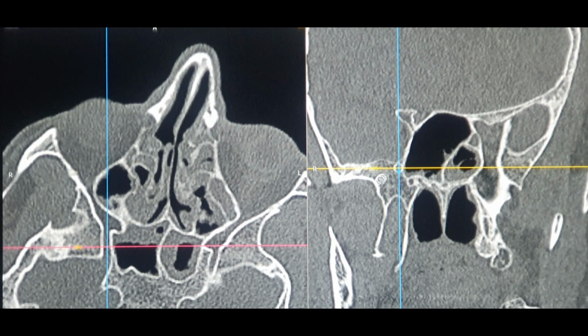This is a pterygoid wedge. The origin, or the powerhouse, of the JNA, I guess the most common cause for recurrence, is that if you do not remove the JNA from the wedge over here, it's going to recur as always. So that is something you have to keep in mind.